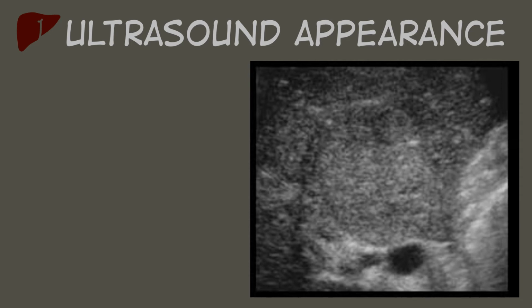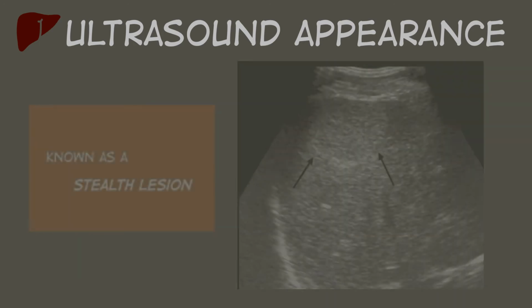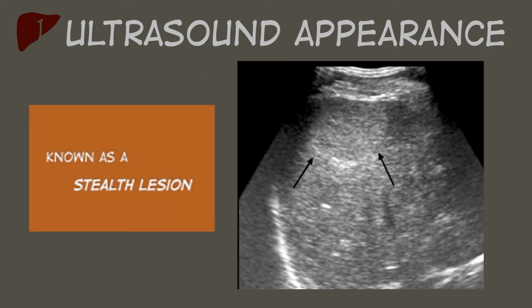So here we have a picture of a liver with the FNH lesion centrally in the picture. Now if you look at where the FNH sits compared to the liver, you can say that those are rather isoechoic. And that makes sense. It's made up of all the same elements. It makes sense that they look the same under ultrasound. In fact, FNH lesions are so hard to see that they are known as a stealth lesion.